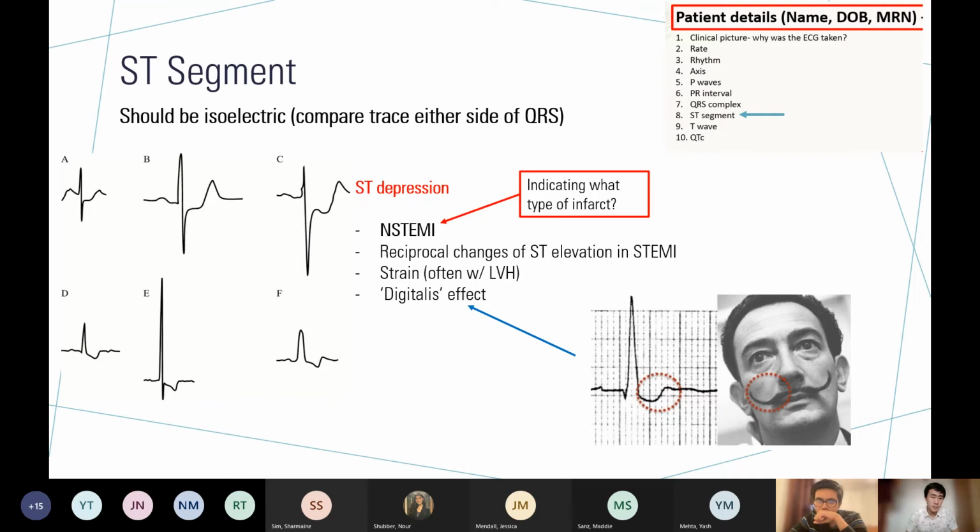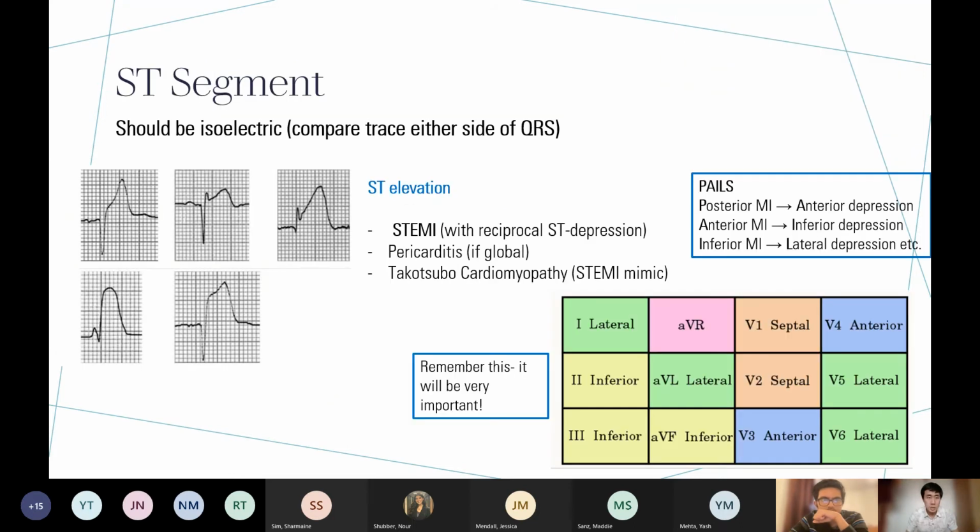Subendo, exactly. It's not quite so serious. Good. So here, if you compare with the previous slide, look before and after the QRSs, it's much, much higher afterwards. So this is ST elevation. And the most alarm-bell-ringing thing that you should see is STEMIs when you see this.